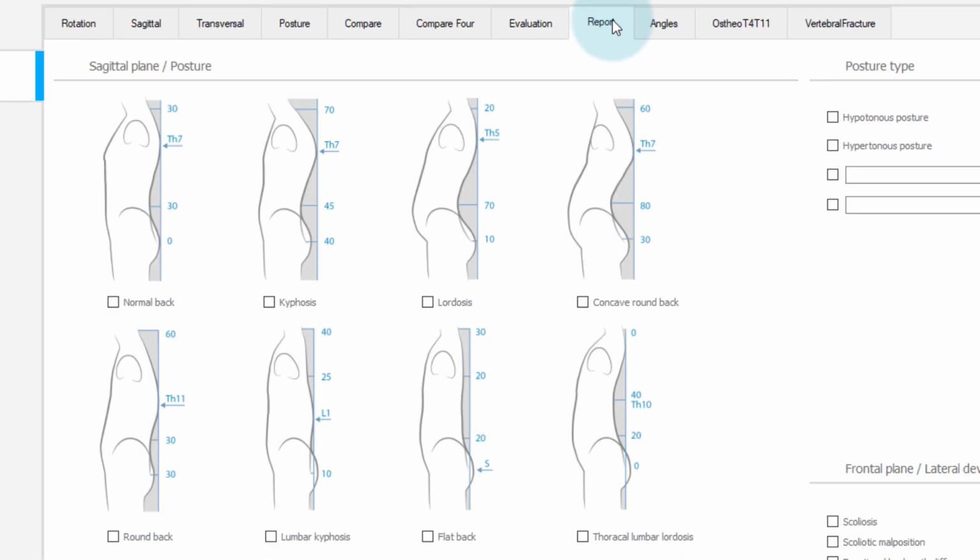As can be seen there, the definition for determining a normal back is a flèche cervicale and a flèche lombaire of about 30 mm, so the same length. This makes the classification a little easier. Note, however, that it rarely happens that the values or even the ratios match the definition at 100%. We then speak more of tendencies.